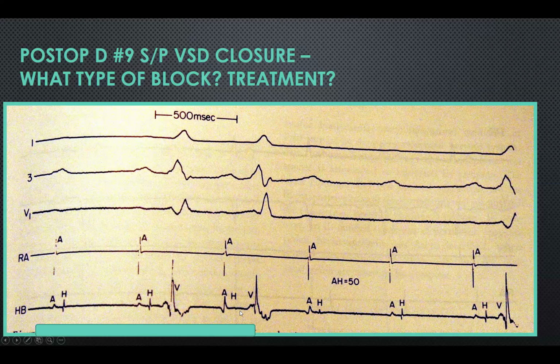So this is actually now normally when people talk about Wenckebach block, which is Mobitz type 1 block, we see that the A to H interval gets longer, which is on the ECG displayed as a PR lengthening. But this is an example of infrahisian disease where the HV interval is getting longer, and then we actually have two beats that don't conduct. So is this first degree, second degree, or third degree heart block, Maya?